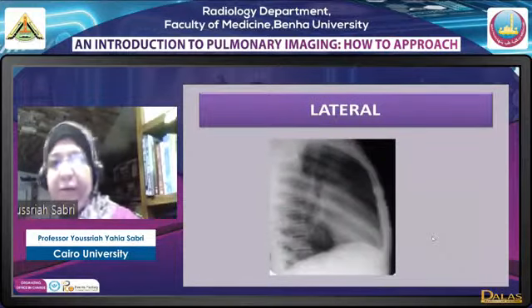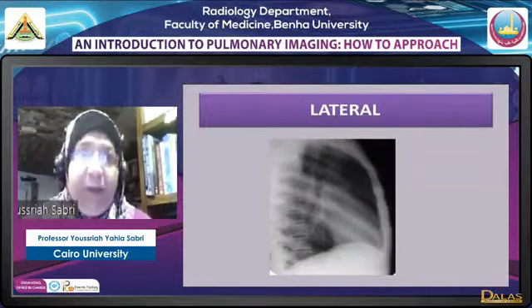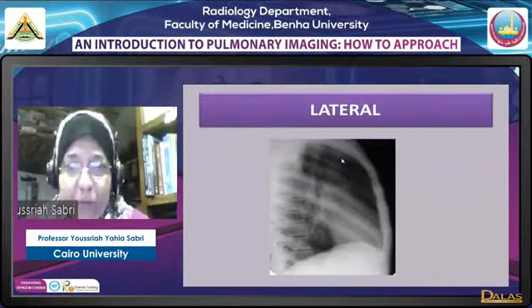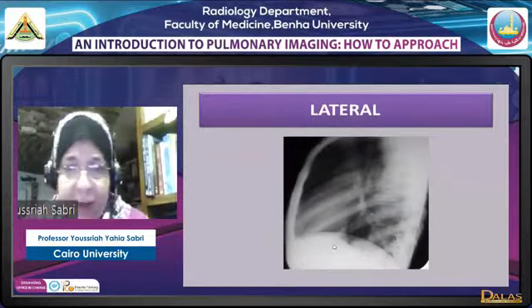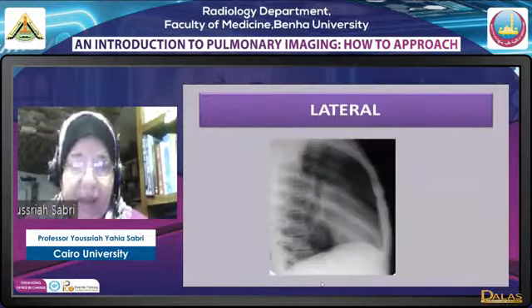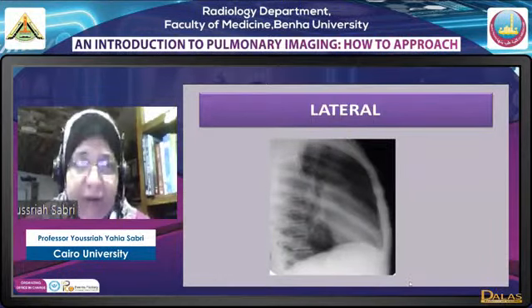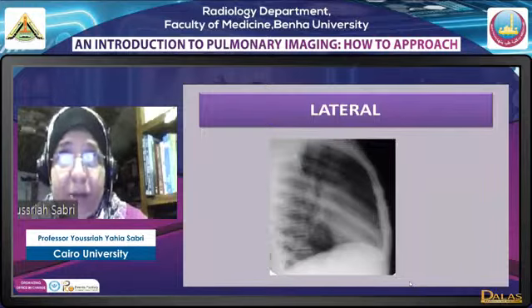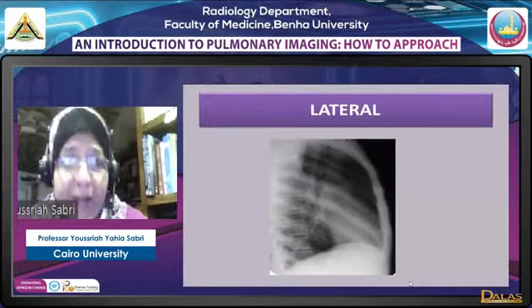What about the lateral film? Main indication of lateral film is to localize a lesion, confirm the presence and to localize the lesion. من الحاجات اللي يعني في بعض الناس بتبقى يعني بتحب تسأل عليها قوي حكاية the right lateral left lateral. Actually the routine lateral that should be done زي ال PA is routine, الروتين lateral is a left lateral.